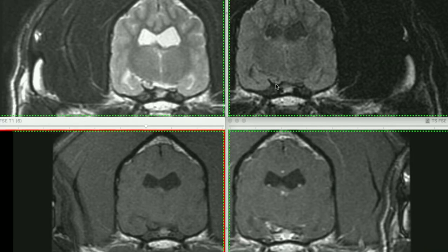We can see it on the FLAIR sequence, some suppression of signal, or certainly an area of low signal here, which might suggest that there's perhaps a degree of cyst formation associated with this lesion. It's hard to see because it's so small. But we can confirm it on the T1, where the lesion is still visible, and on the post-contrast images. In this case, I think it's particularly helpful where we see abnormal focal enhancement of this abnormal tissue, but also of the adjacent meninges.